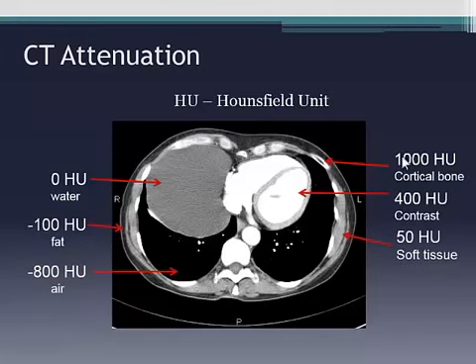So what you can do confidently on CT is say when something's got fat in it. That can be helpful, for example, if you're looking at fatty metaplasia, maybe post-infarction. There have even been descriptions of looking for ARVC on CT imaging. So CT is a very robust way of identifying fat, and you're relying on this negative Hounsfield unit.